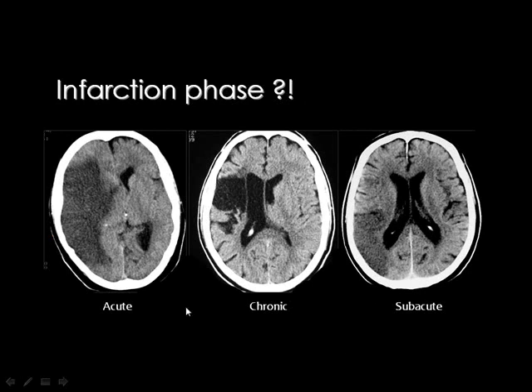The acute infarction is an infarction which is surrounded by brain edema, then it has the chance to compress the ventricle. Then we call this acute infarction. But after some time, this infarction will liquefy, and the brain tissue will be liquefied, and transferred into an area of fluid density. Then the result will be loss of volume of the infarcted brain tissue. Then the ventricle adjacent to the infarction will dilate to compensate the loss of volume.